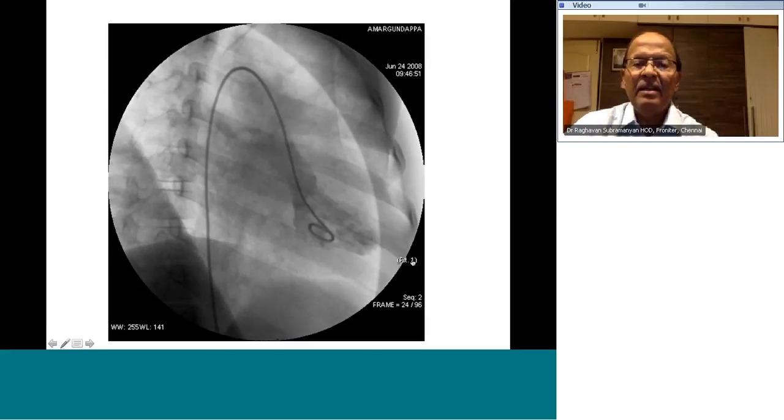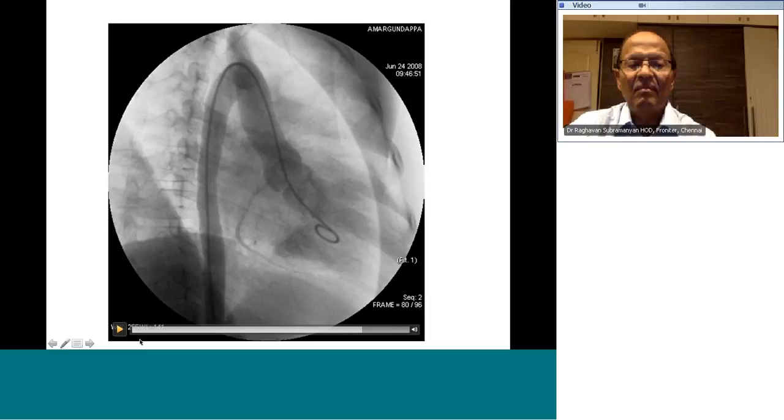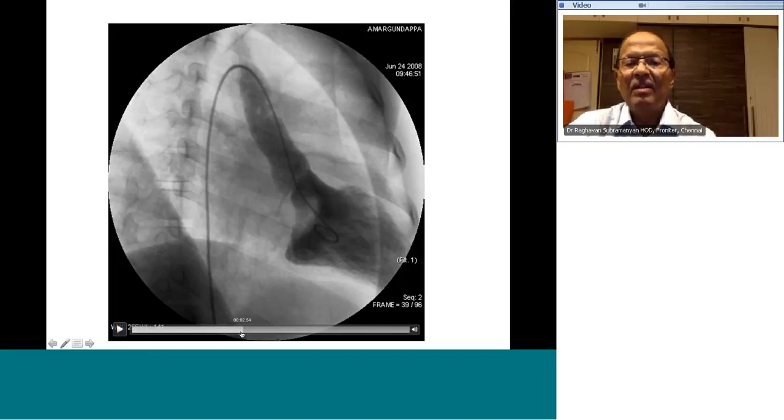Now compare that to a normal LVA, you don't get a gooseneck. In a diastolic frame, you don't get a gooseneck. The atrioventricular septum is present and the LV outflow is wide open here. The posterior length of the interventricular septum is as long as the anterior length of the interventricular septum. This length and this length are equal. In AV canal defect, it's scooped out like this. Okay?